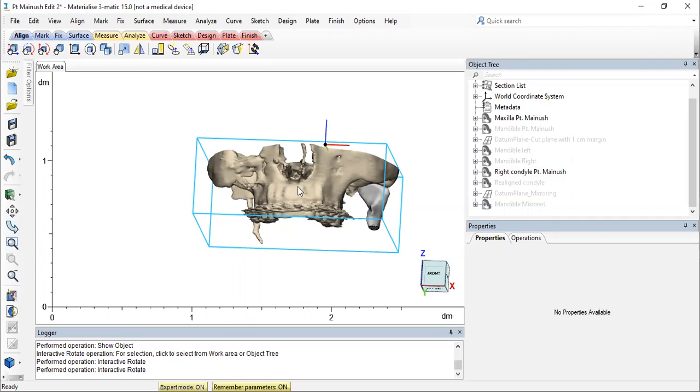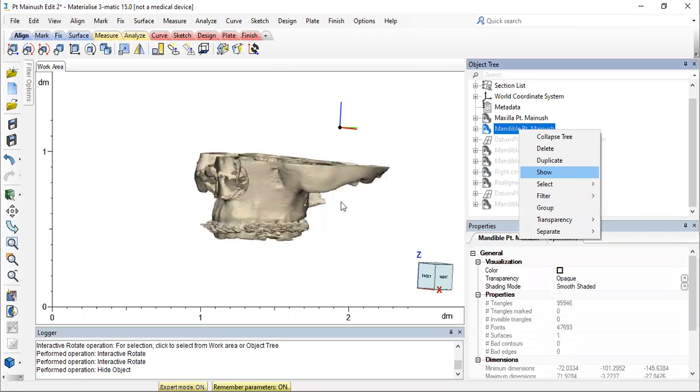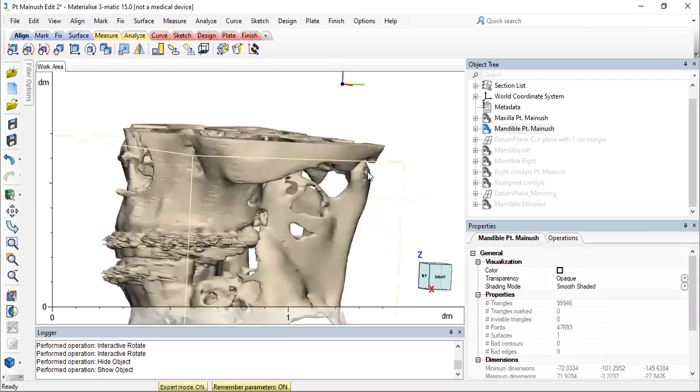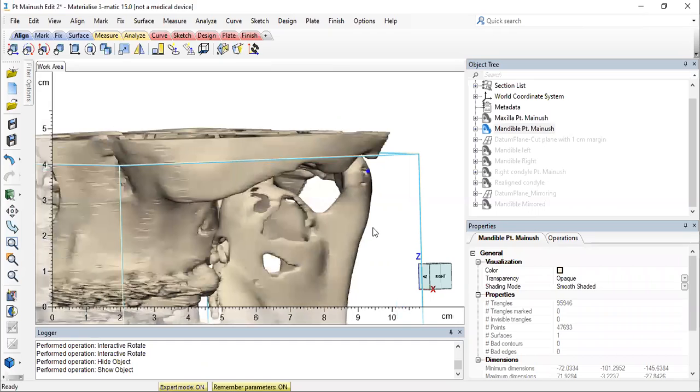I'm highlighting both things. Here, the patient's condyle is preserved, which is good. Just in case only the right side or whichever healthy side is preserved, I'll tell you the alternatives beforehand. I'm addressing both concepts, wherein you have a healthy anatomy. Ideally, what I would have done is, this mandible that you see, I would not even mirror it; technically I would just make a cut from here, because I know this is a good, healthy-looking, well-preserved condyle. So in such cases, we just cut this section, or however much we think is required to recreate my PSI, and accordingly we proceed.